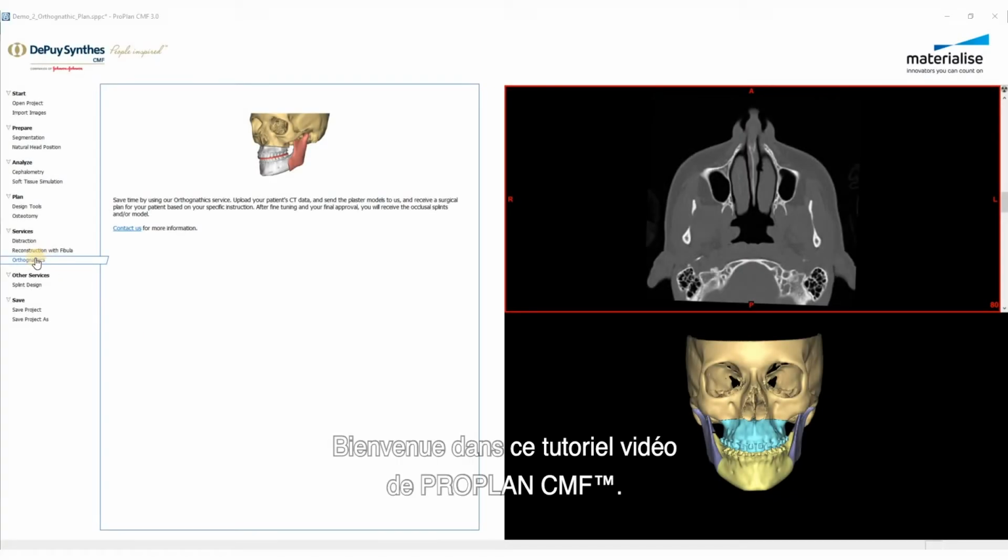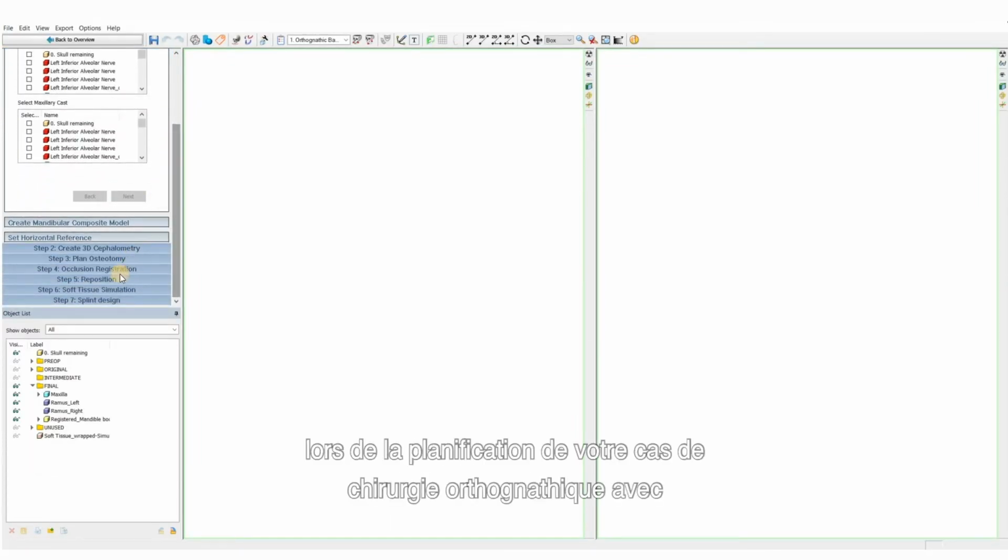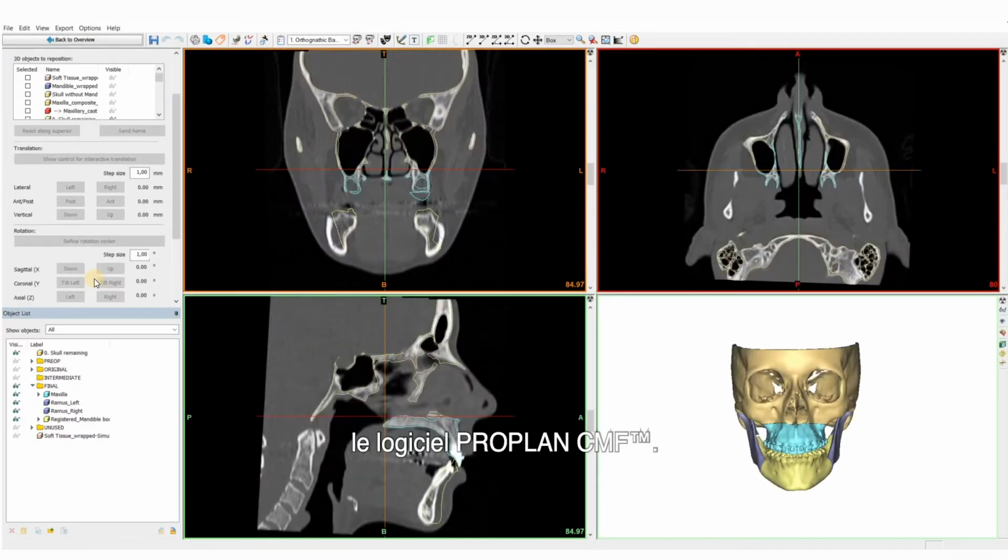Welcome to this ProPlan video. In this video, we will show the 3 steps to follow to plan your orthognathic case with ProPlan CMF.